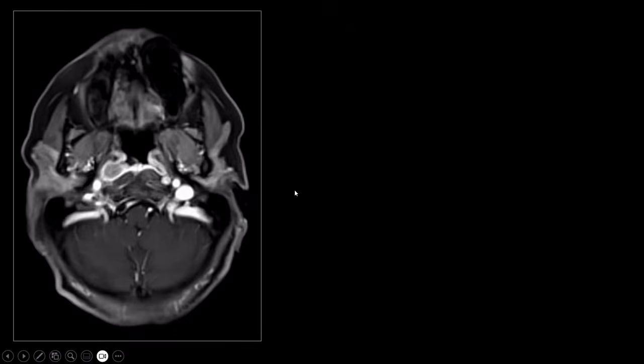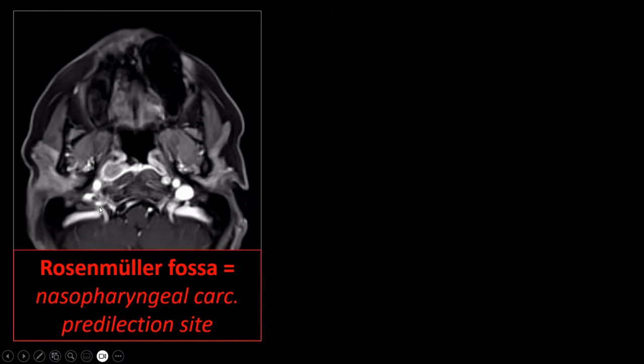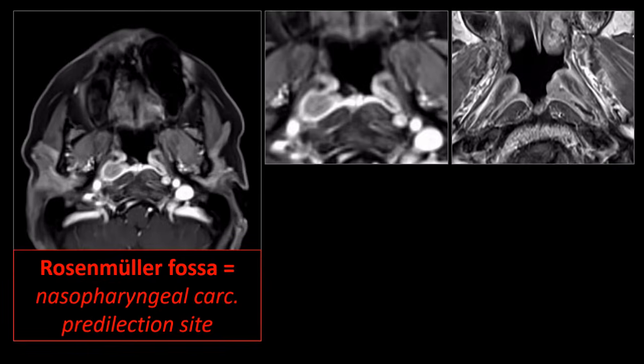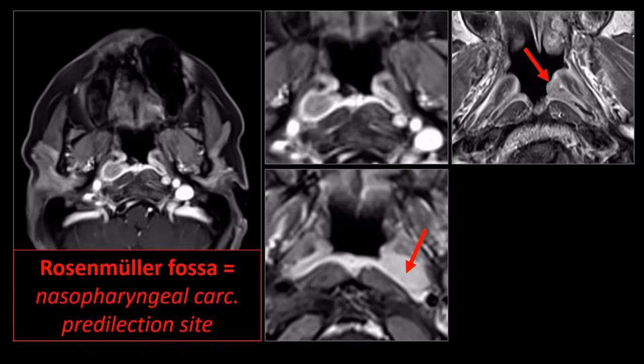So check the nasopharynx, and if you're looking for small tumors, check Rosenmüller's fossa, because this is the predilection site for the development of nasopharyngeal cancer. And here we see several magnified views of the nasopharynx, and we see small tumors located in Rosenmüller's fossa in each and every one of these patients. So see them over here.